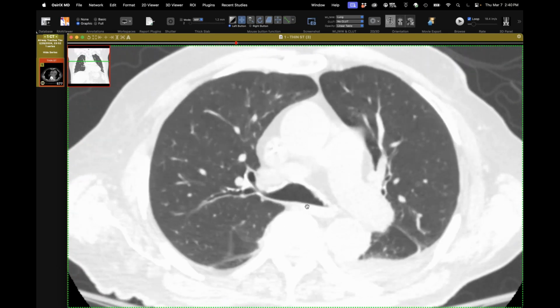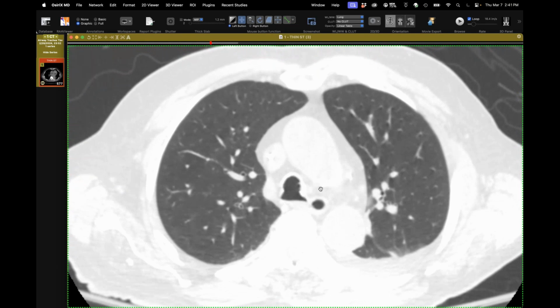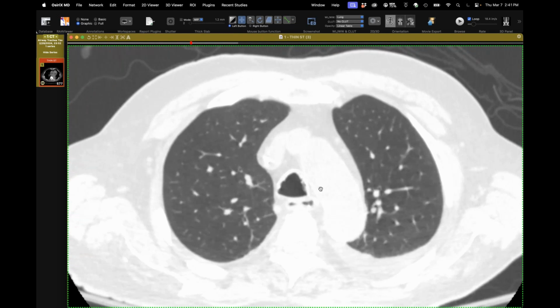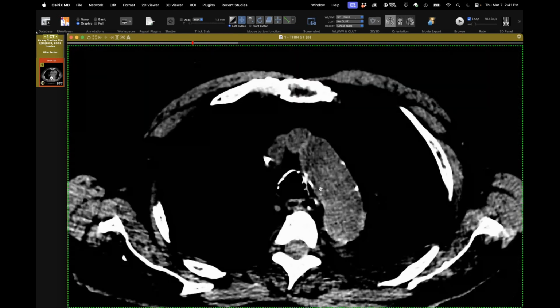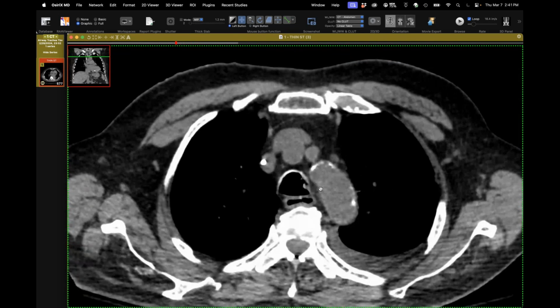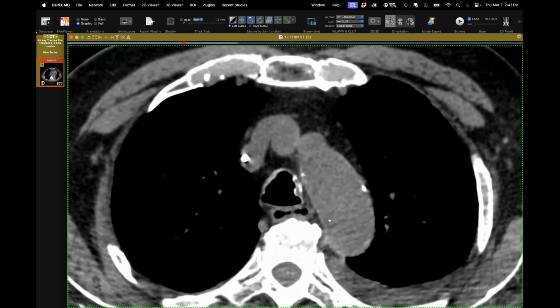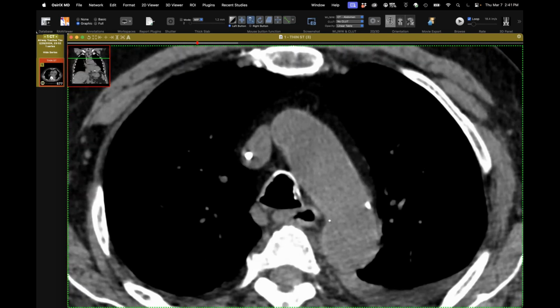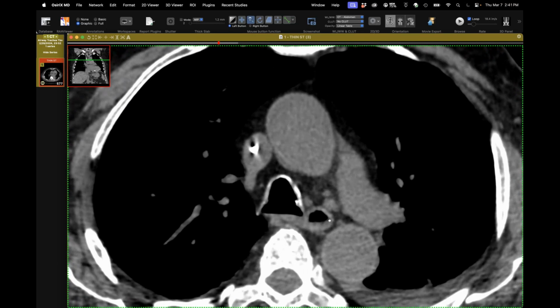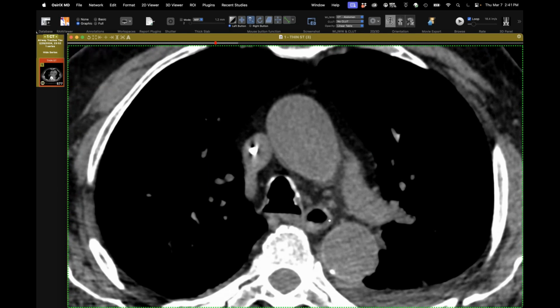which is really just a hypertrophic response, probably to chronic irritation. And usually you see these small, smooth bumps, which you ignore, usually in patients who've smoked. But this is one of the few. Arlene showed one years and years ago, when we first started this conference, a pretty exuberant TBO, and I think this is probably a second place to it. But apparently it's something they are studying for their boards and it shows up in various situations. But I don't know, it's so rare. I mean, considering all the CTs we look at all the time, I've never seen it this exuberant myself.